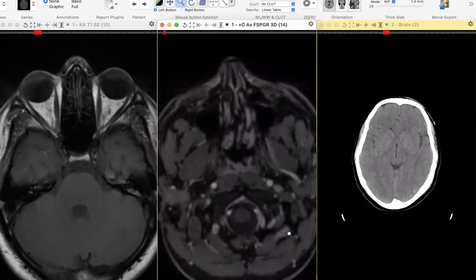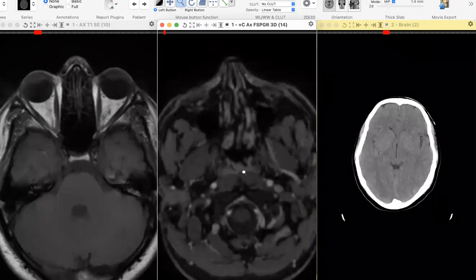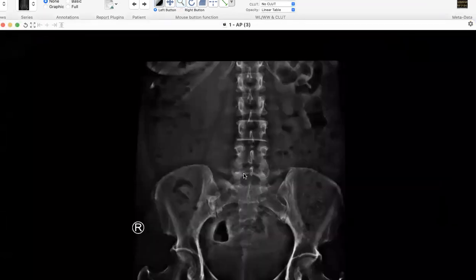The next case was this. Pelvic pain. Expect this case in the exam, and you have to pay attention to these calcifications. There's a nice molar tooth over here, there's a canine tooth over here. Okay, maybe this is fat, maybe this is gas, but they are definitely calcifications.